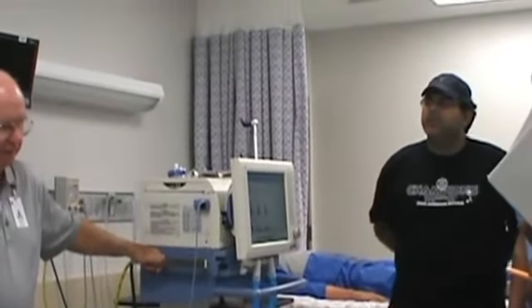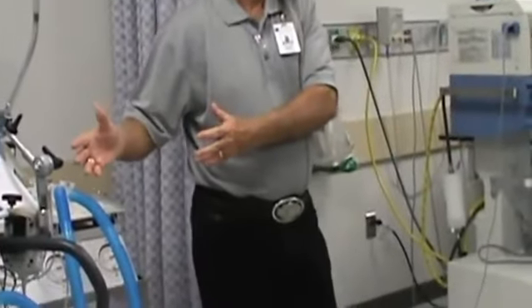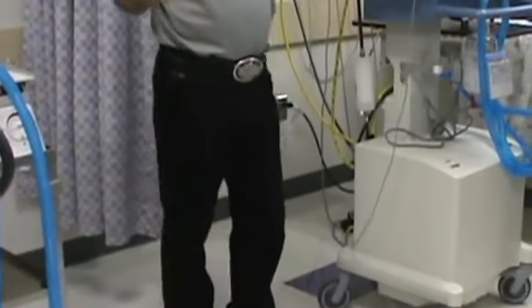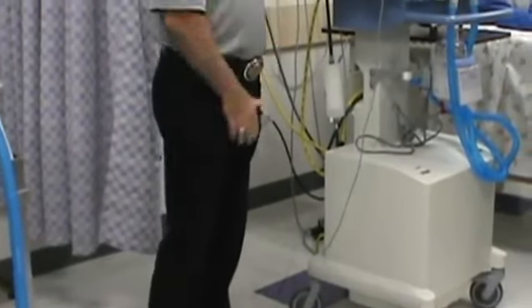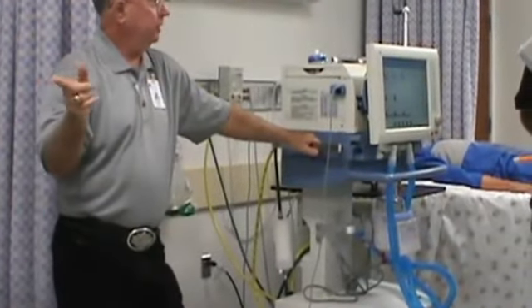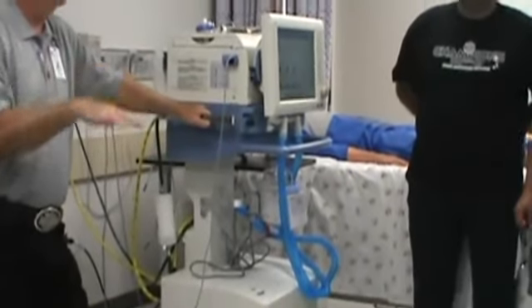The fact they're jumping around is probably the downside to ventilating patients: the more you let them take over, the less control you have. So there's greater variability in what you're going to see occur. But that's all part of the process of getting them off the ventilator. But look for a tidal breath delivery by the machine at the point in time things appear to be relaxed and not out of sequence.